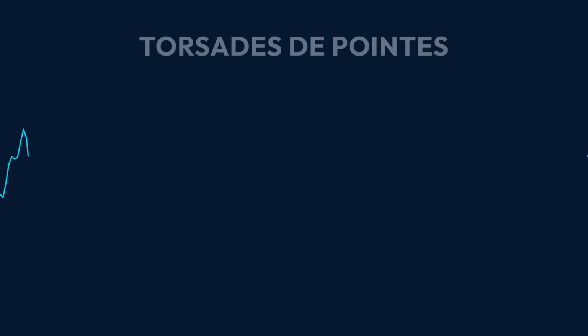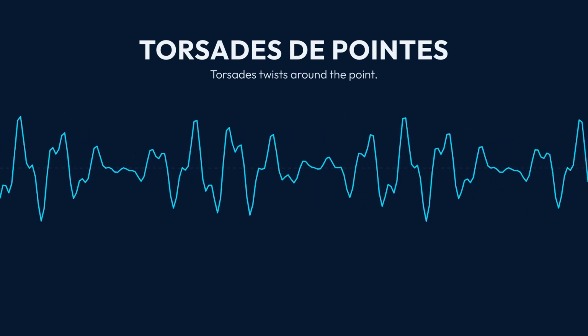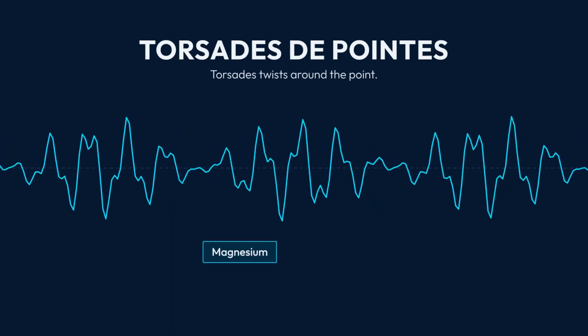When giving adenosine, warn the patient they may feel a transient sense of impending doom or chest pressure. A short pause on the monitor is expected. Always give it as a rapid IV push in the port closest to the heart, followed immediately by a rapid saline flush. Rhythm 8 is Torsades de pointes, a polymorphic ventricular tachycardia that twists around the baseline.